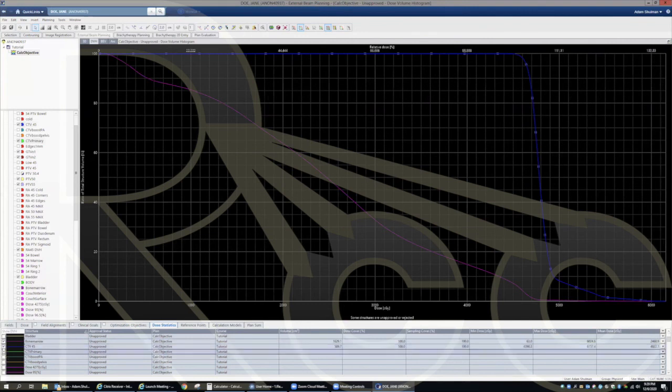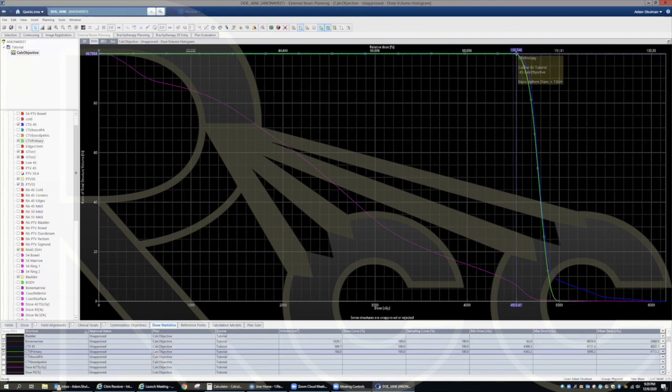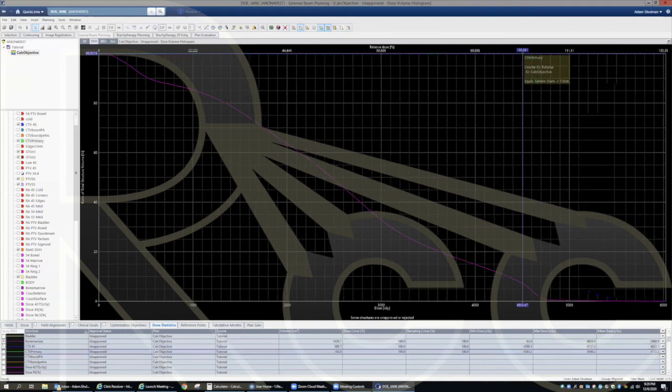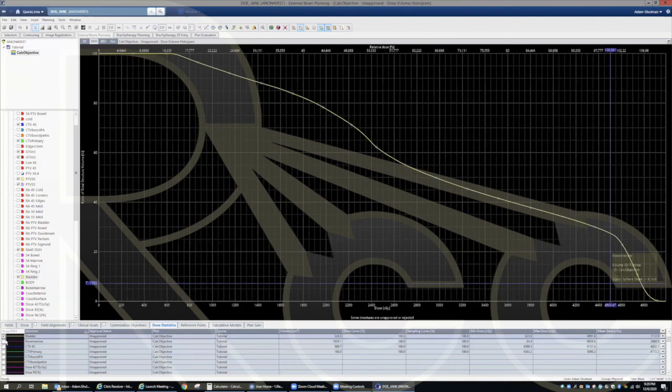Here are the 2 CTVs. So 45 gray is here. They're both getting 100% coverage. Good CTVs. I'll look at one at a time so we can see. Again, I'm not going to analyze. There's overlap in different PTVs with the bladder.